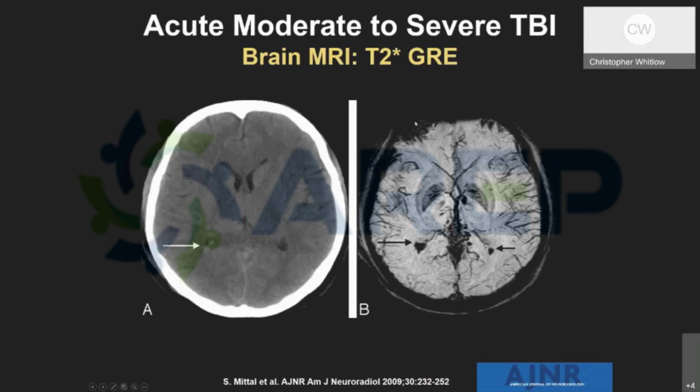New susceptibility weighted images with quantitative susceptibility mapping, which really haven't been scrutinized to this level, are also available and have some unique characteristics for evaluating intracranial injury, like being able to determine if something is a calcification versus blood, but has not been as rigorously studied as T2 star gradient, because that's been around for a lot longer.